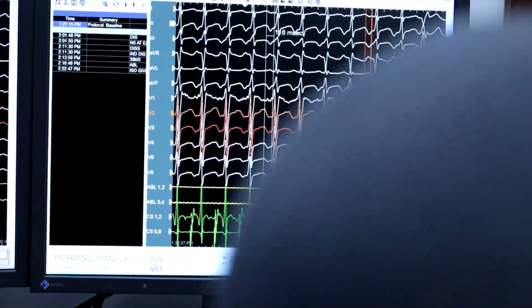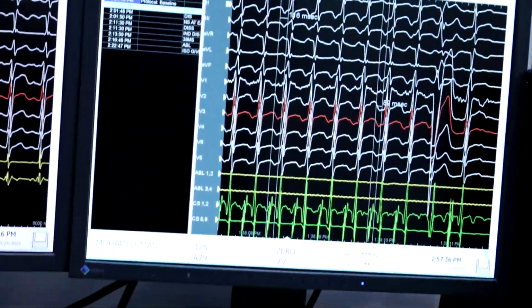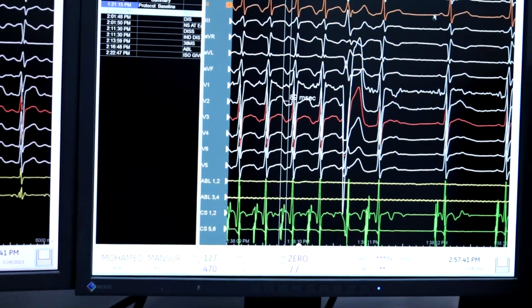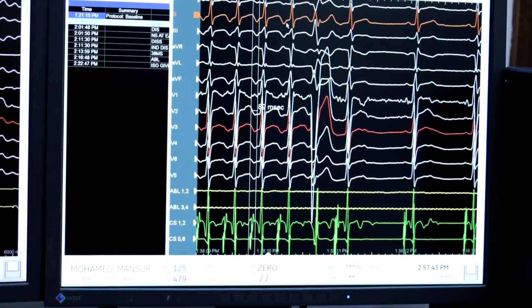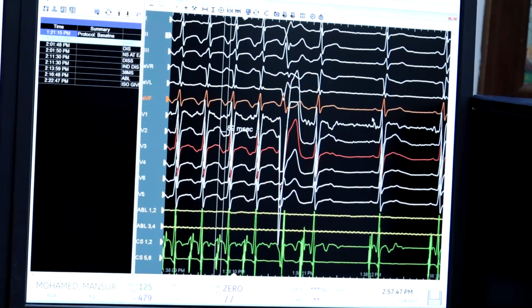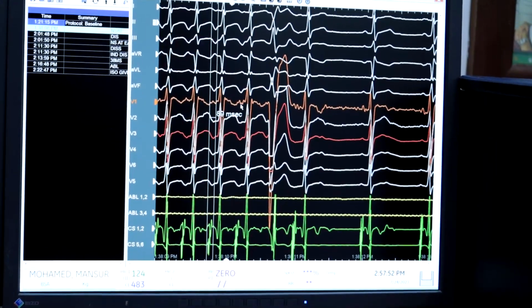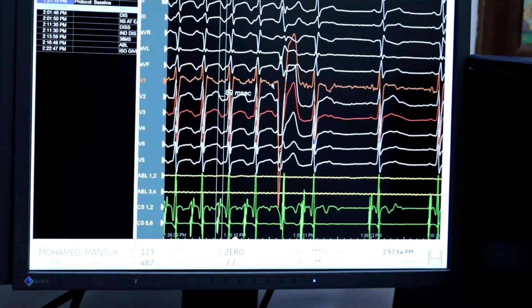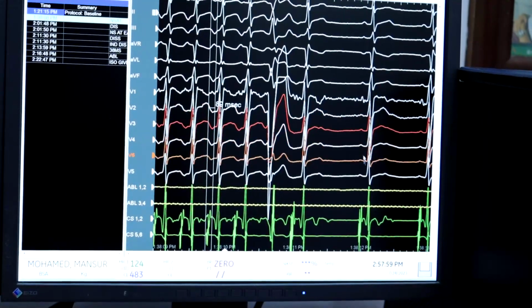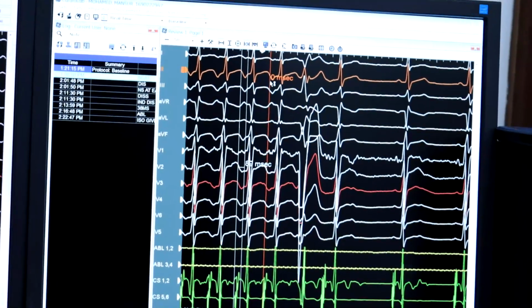This is how I look at the P wave. If I look here, this is V1, I increase the gain, and these are the limb leads, and you can compare your P wave during tachycardia with the P wave here. Even his V1 is not that big, and his tachycardia V1 is positive-negative. You can see that. Here the chest leads are all positive, and here are positive also. We mark this here.